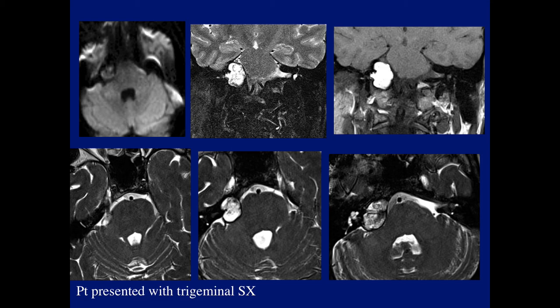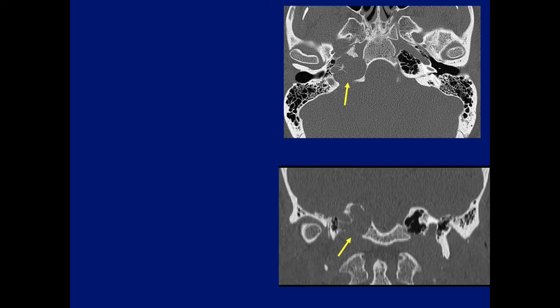My philosophy in skull-based lesions is always do 2 studies. If you see a lesion on MR, maybe CT will help. If you see a CT lesion, definitely do an MR if you're not sure what's going on. I presume everybody's eager to see the CT. Okay, what is happening now as far as the differential that was mentioned so far?